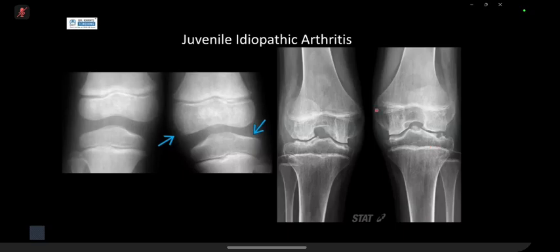Patient has these long gracile bones, flaring of the metaphyses and epiphysis with osteopenia, erosions and all of this, the joint space narrowing. So remember, in inflammatory pathologies, even in kids, your joint space narrowing is diffuse because it's coated by synovium that's inflamed, versus in an older patient where osteoarthritis is quite focal because it's due to the weight-bearing aspects. Okay, so inflammatory diseases affecting the joints often give you diffuse joint space narrowing and not focal.